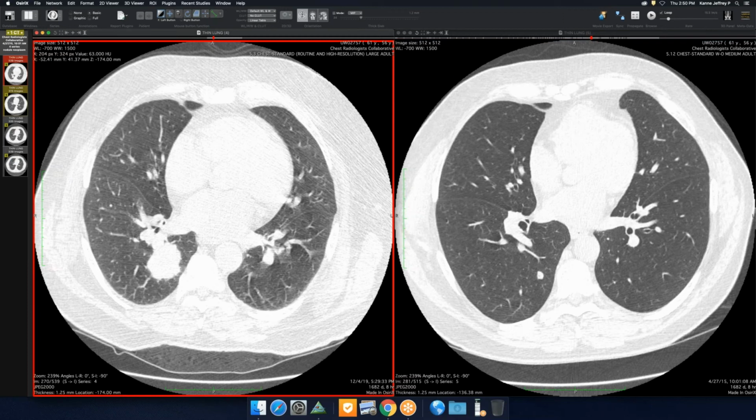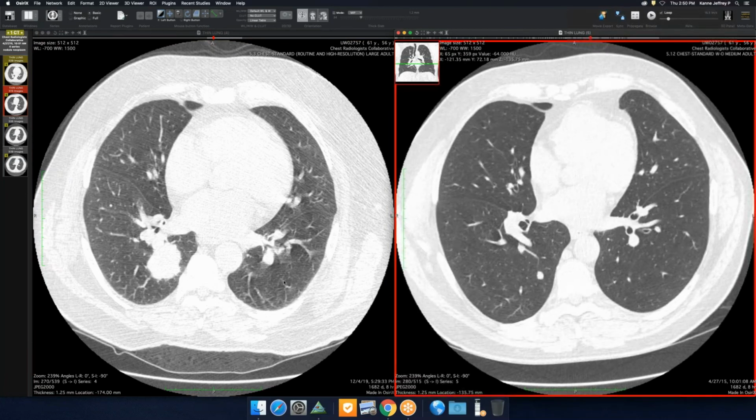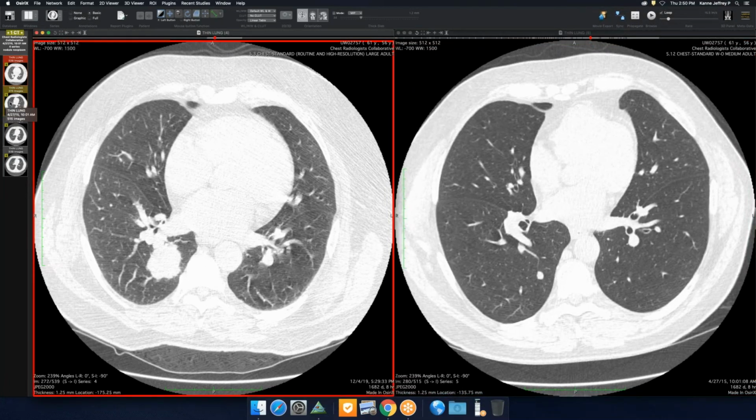Yeah. There's a finite chance, of course, that the new lesion engulfed that thing. I know it's in the same place, but it's very possible that the nodule was benign, and the other thing just happened to grow in the same part of lung or nearby.